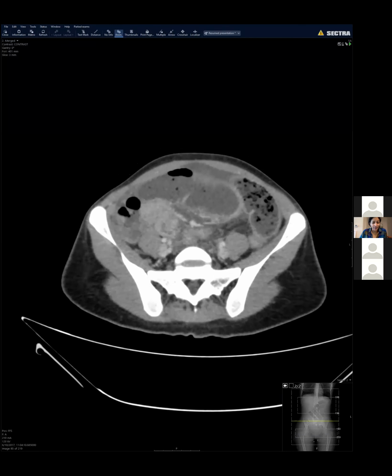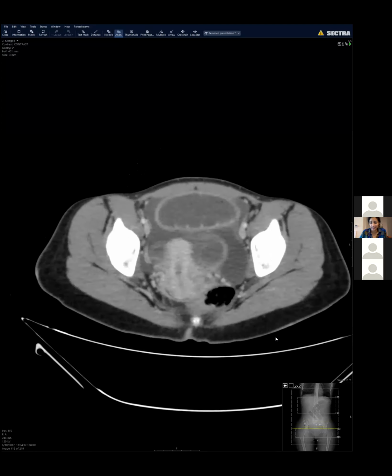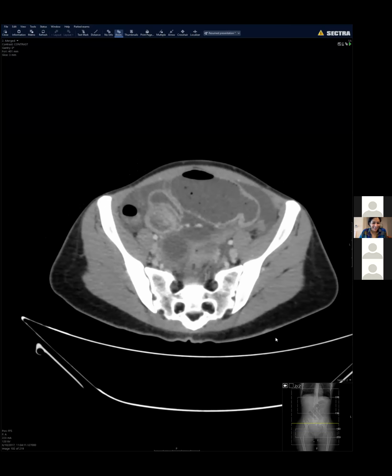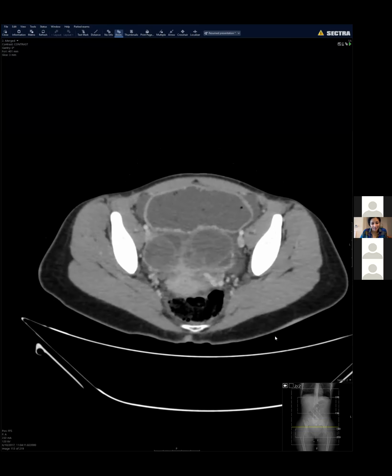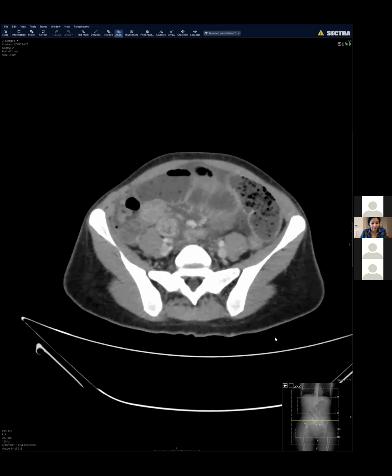Yes, endometriomas and related to an intussusception. We've got more people also saying endometriosis. Okay, I think that's a great thought too. TB can also hit the ileocecal valve. Sure, that's so travel history, if she's from an endemic place, all that matters.